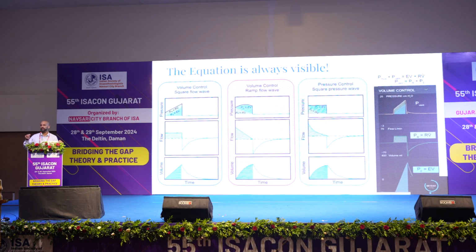Every microprocessor in the ventilator can only control one of those variables at any given time. It can either control pressure or flow. It cannot control both at the same time. And all the pieces of the equation are always visible to you on a ventilator screen.